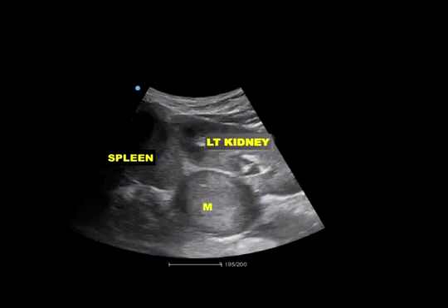So in this patient, at that point in time, we are able to say you have a left suprarenal mass, but without the biochemical or the presentation of the patient, you are only able to say it's a left suprarenal mass, and you're left saying, is it an adenoma, is it a phaeochromocytoma, is it an adenocarcinoma? But with the history, you profoundly say, I think this is a phaeochromocytoma.